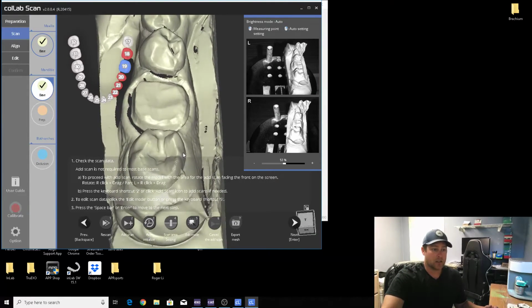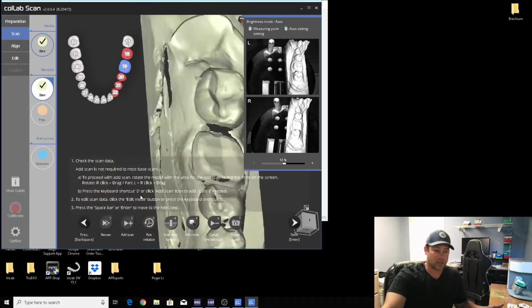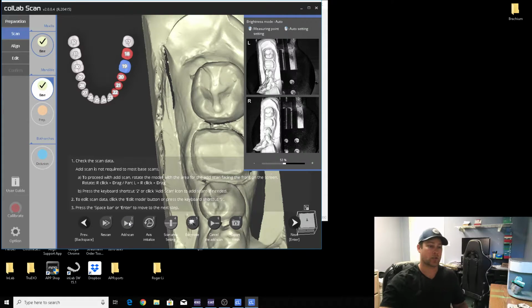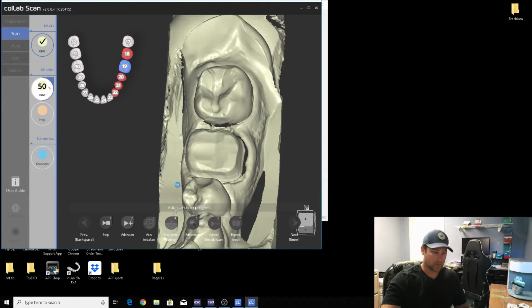Again, check contact area. It's always nice to give it a second scan anyway, because it's always missing data. That's mostly because I set my scans to do the minimum amount of scans, since you don't need that many. I'd rather have the smallest scan path and add my own scans. It saves time that way than having it do a long scan that takes 2 or 3 minutes.